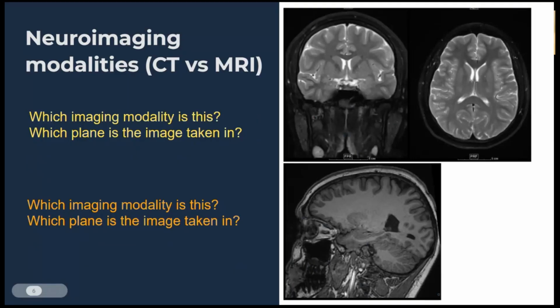If anyone could put in the chat which imaging modality they think the first one is, and which plane they think it is. Start off with the easier one: which plane do you think this image is taken in?